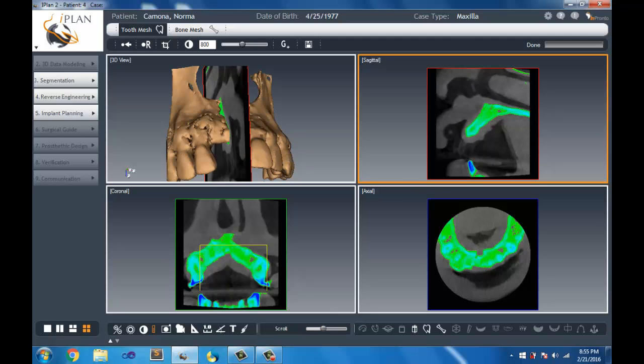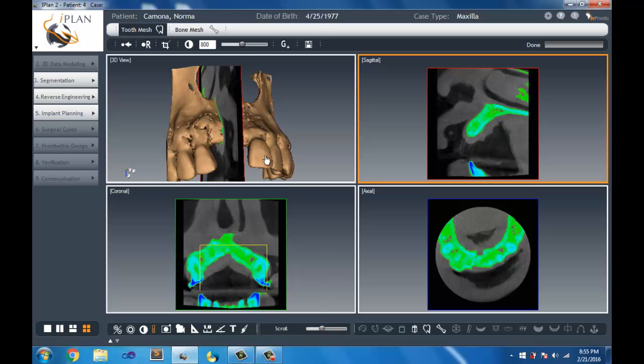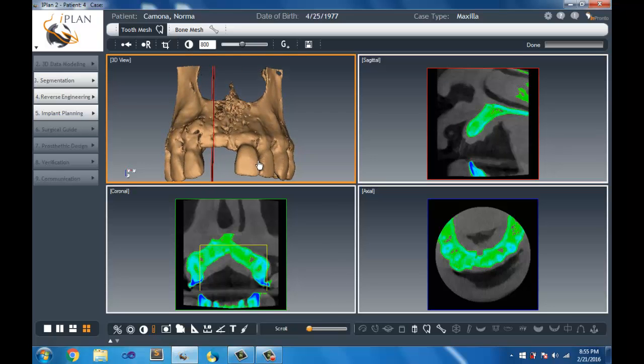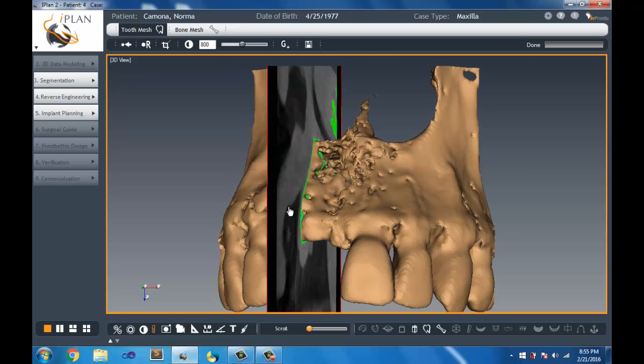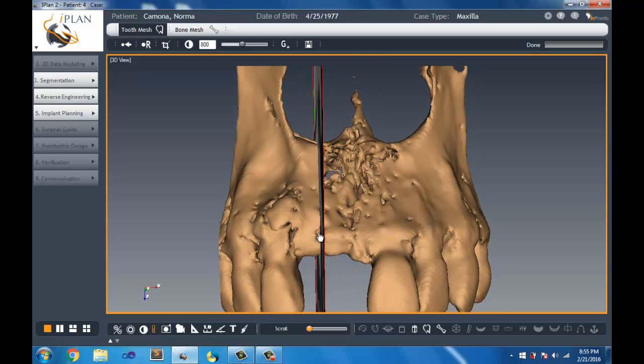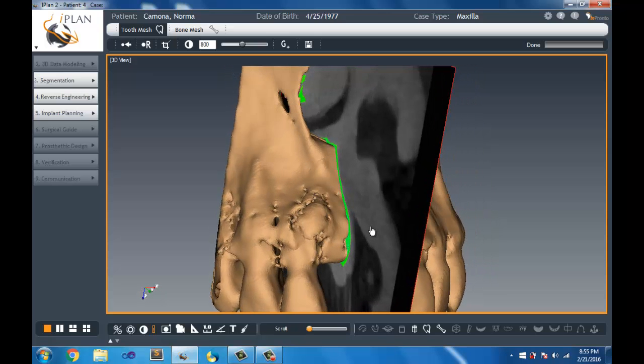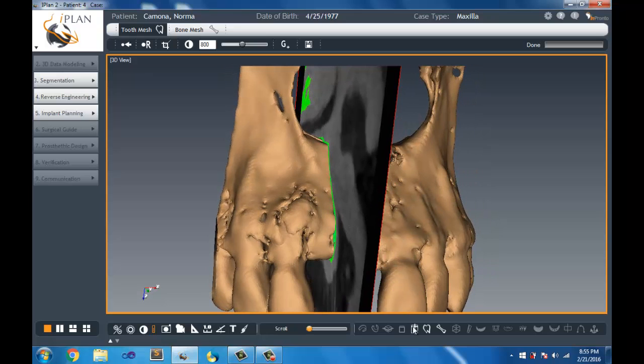We have a very decent buccal lingual width of the bone, and so as a result, I would say we have sufficient bone to place a nice implant, but maybe we would not drill the site. We would use the osteotome to expand the site and place a nice implant in there. One other thing is the quality of the bone here on the extraction site of tooth number 8 is not the best, so augmentation with some bone grafting material is probably necessary.